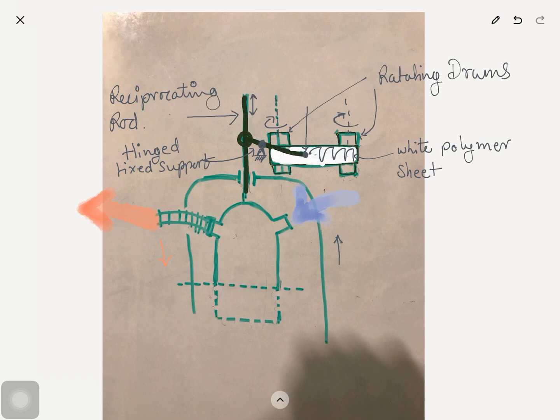As we know, the air in my design comes in on the right side. So air comes in here. On my upward stroke, the air comes in, and on my downward stroke, this valve gets closed, and this valve gets open and my air goes out. And this connecting rod is carrying out a reciprocating motion right here, and this reciprocating motion is used to find out how much air and at what pressure my ventilator is blowing out. So let's see this design.